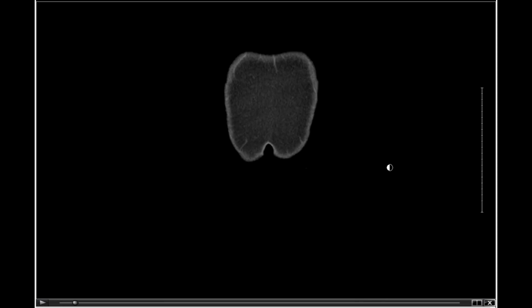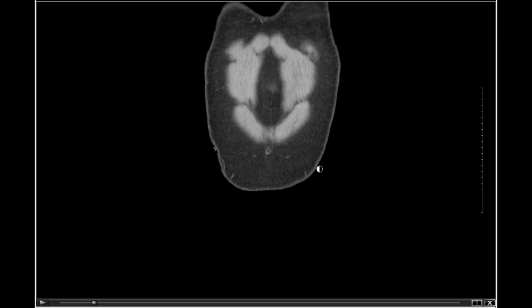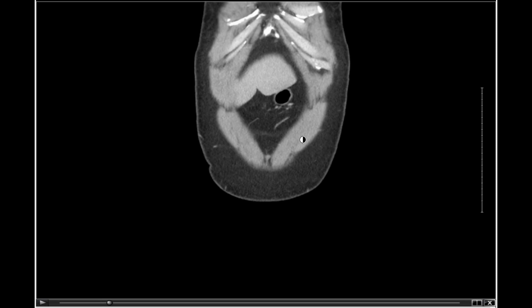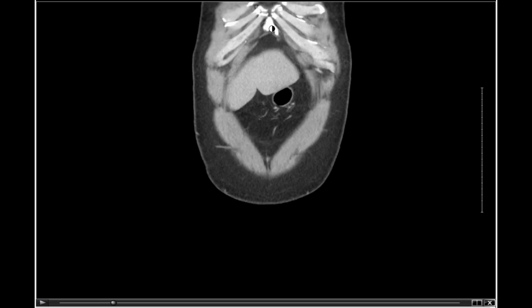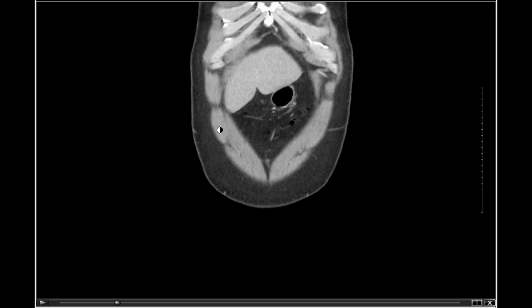So, we get started. Just a bit of abdominal fat there. I'm working on it. And nice big opening for the umbilicus there. And we move a little further in. We're catching some musculature here. That's the rectus abdominis muscles. And right away, I'm starting to see my costal cartilages and xiphoid process meeting up with the inferior side of my sternum. Now, since this is an abdominal CT, we're not going to see a whole lot of the thorax, sadly. But right here, we can already see the liver poking through as we go into the body.